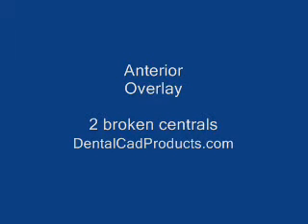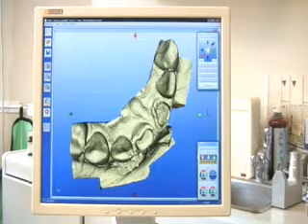I will be demonstrating the use of the anterior overlay from Dental CAD products. In this case, the individual had two central incisors damaged in a fight. This case will be done in database. The virtual model you can see is going from cuspid to cuspid.